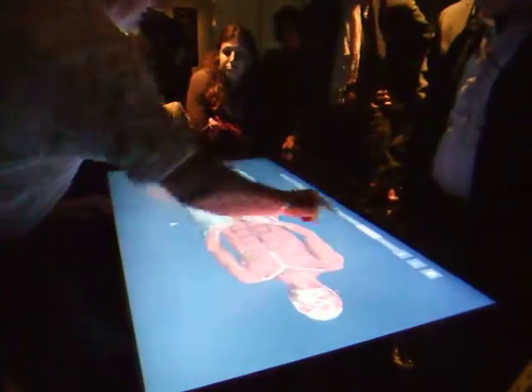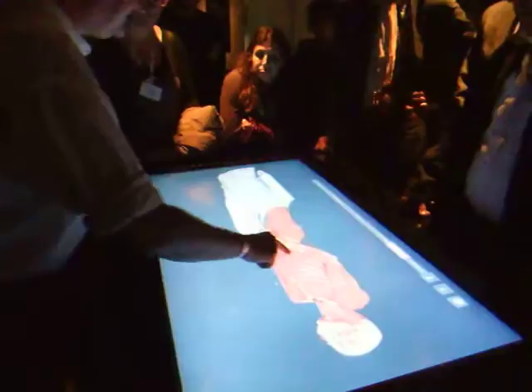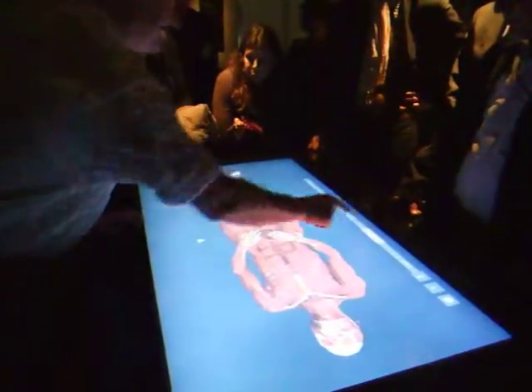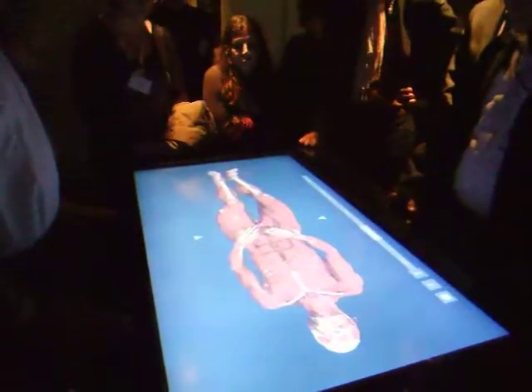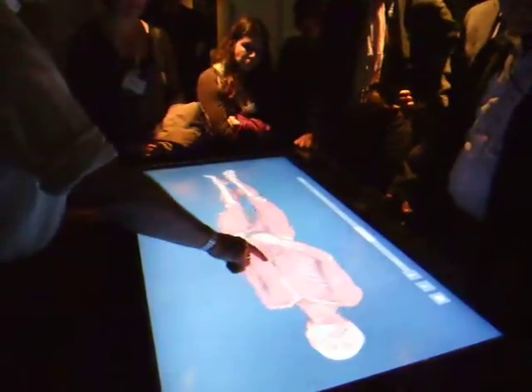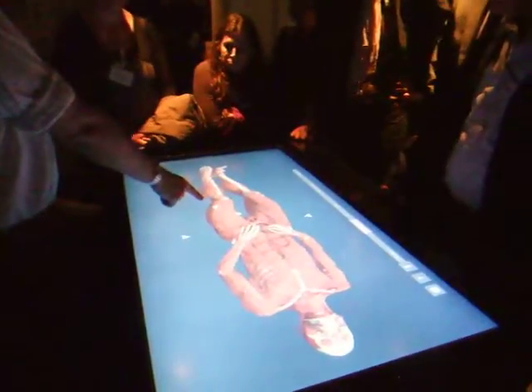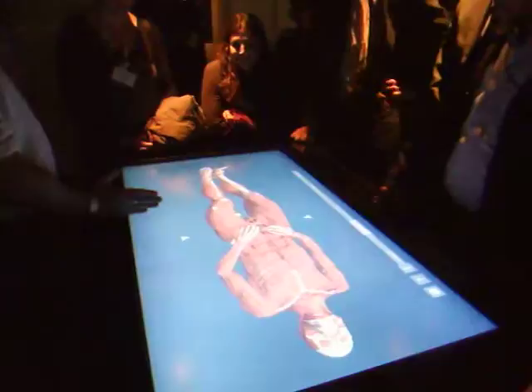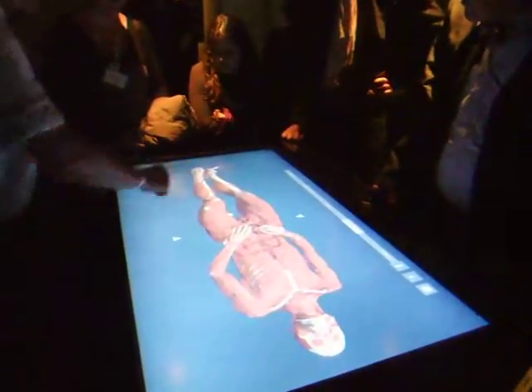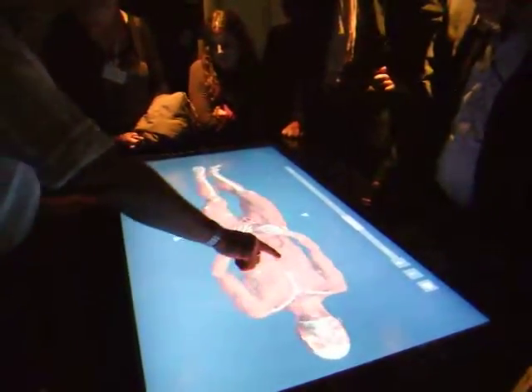Transfer functions. We can change the individual tissue, so we can make different things disappear. So we can remove the body bag by making it transparent, and we've also made the skin transparent, and we start to see some of the damage from the accident. That, for example, doesn't look quite right. That's the top of the car bonnet. The bottom of the car bonnet, there's another break just there. So you can see that there's clearly some injuries.